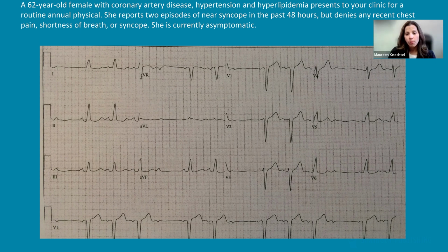Okay, so with Mobitz 1 and Mobitz 2, second degree type 1 versus second degree type 2, they are both going to be associated with a slight irregularity to the rhythm. So that's one thing that should make you think about, what is my differential diagnosis? Lots of things can do that, but we look like we're dropping beats. Okay, so let's look here. Here's a dropped beat, and here's a dropped beat.